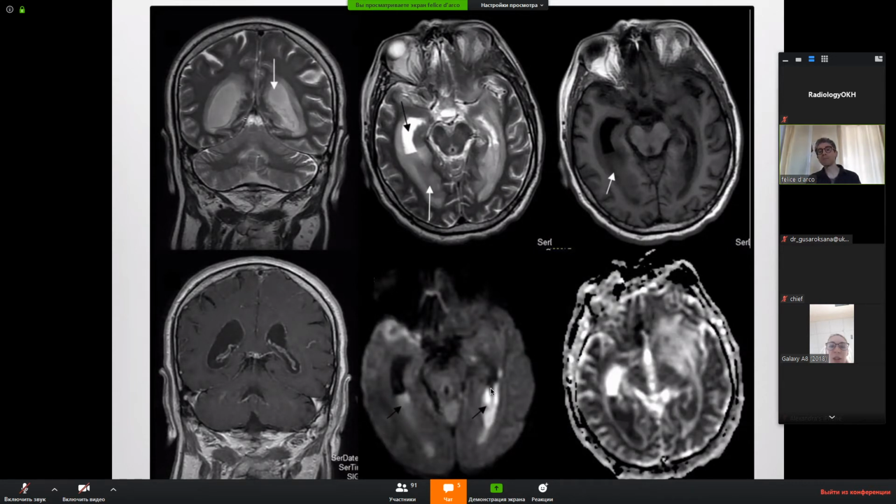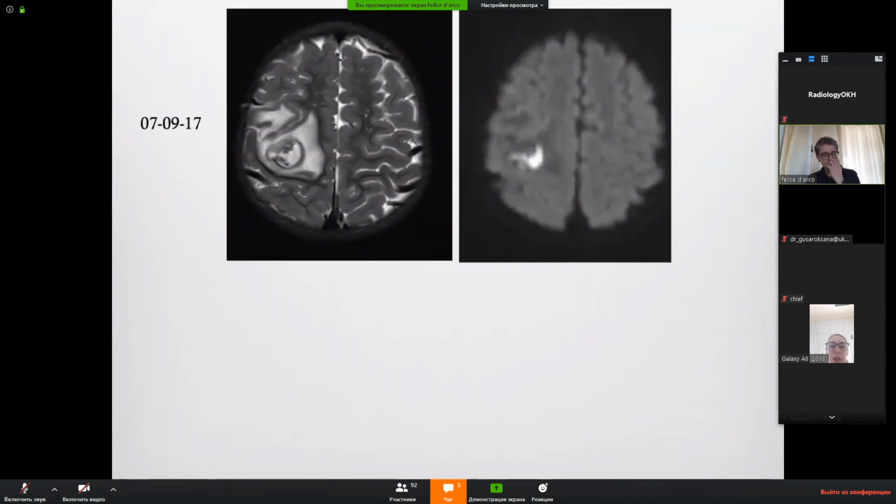So this is a ventriculitis, very, very important. And why is the pus also important? Because this is a child from GOSH, from my hospital, with an abscess, okay? So you have the edema, T2 hyperintense, and then the capsule here, T2 hypointense, a bit of heterogeneity inside, but most of the core is fluid in T2 and shows restriction.